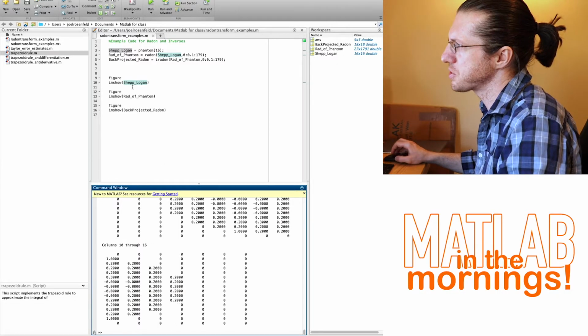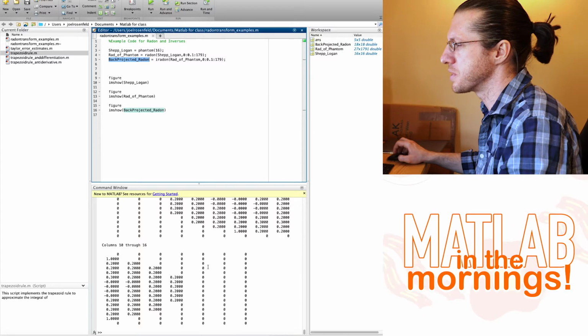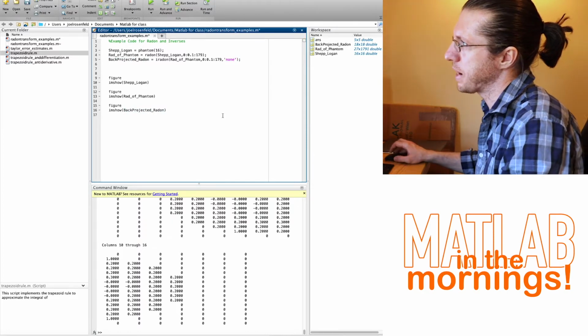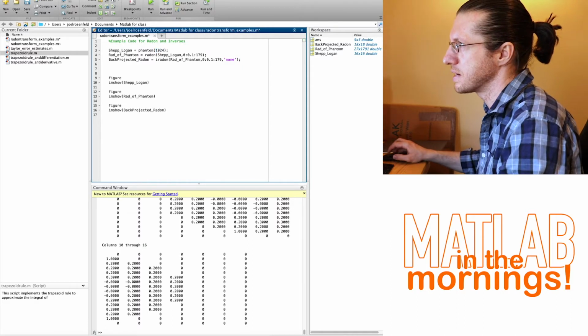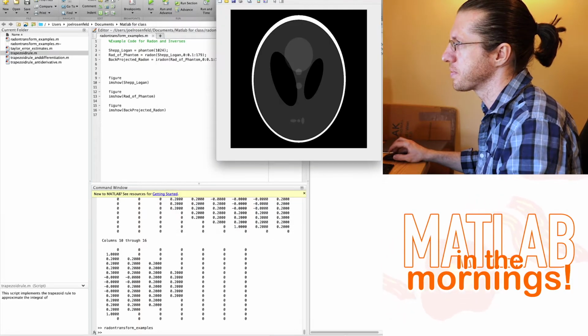Okay, I actually have a feeling if I go back to the back projected, I can get something out of it this way. So using the knowledge that 0 is black and 1 is white, I'm betting when I did the back projection, I got something else. I'm guessing it's saturated at white somewhere. So if we go ahead and, right, so we get whites there.